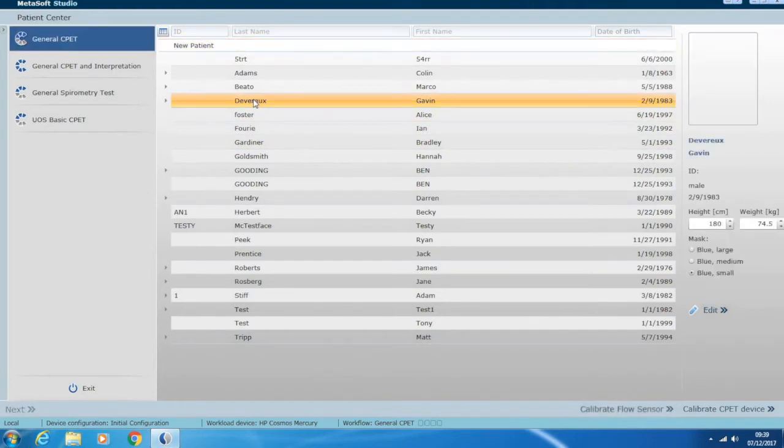And then what you'll notice is if you choose a person, the next function sort of flashes at you. If you look down the bottom left-hand corner, it's flashing next, and that's because you've selected what you need to, and it's just prompting you what to do next.